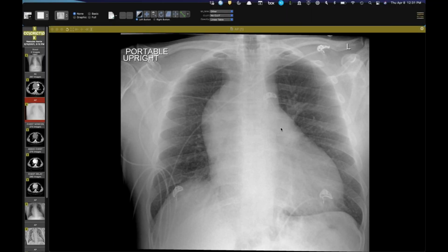You should see a radiograph here. This is a fairly quick one just because it's rather dramatic on the CT. We all know that the aorta can hide on radiographs. In this case, it's not necessarily hiding. There's this abnormal right mediastinal convexity, and maybe it's a dilated esophagus or somebody that has had a gastric pull-through for esophageal cancer. That's not the case here. So you have to wonder about an aortic aneurysm.